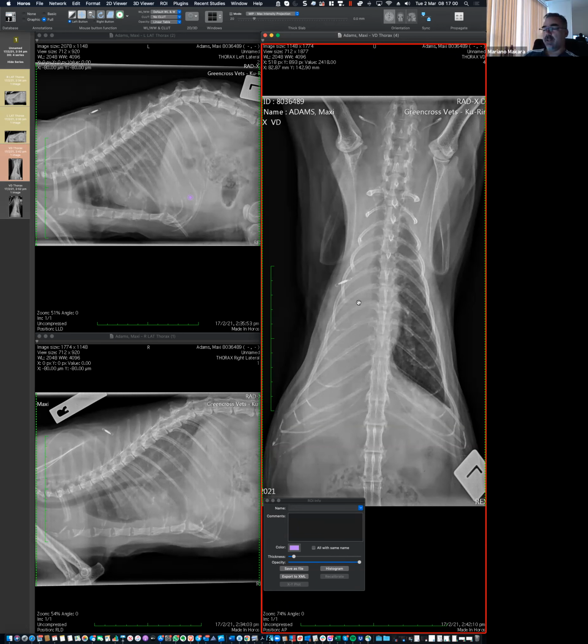So the expectation of having a mass effect, I sign that is there. Then I like that you say, well, what if the space that the pleural effusion is occupying is taken from the lung? Makes sense? What if the lung is completely empty and that space is replaced by pleural effusion? And I have nothing to say. That's perfect thinking. The only thing that I would probably add is that I would think that's a relatively unusual situation, where you have a complete atelectasis.